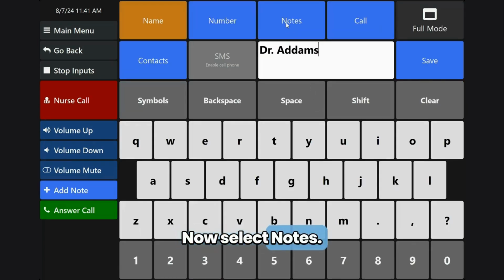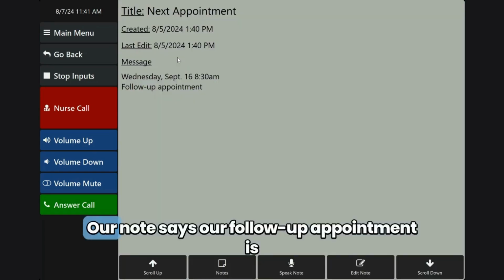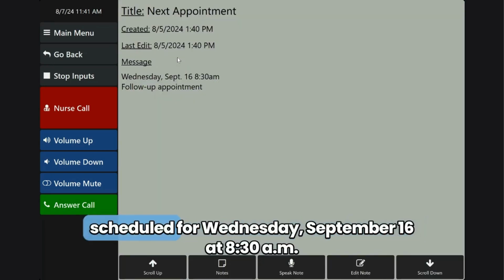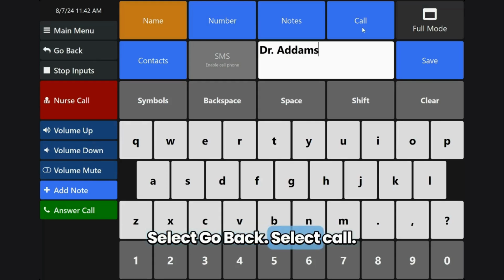Now, select Notes. When is our next appointment? Our note says our follow-up appointment is scheduled for Wednesday, September 16th at 8:30 a.m. We'd like to change that. Select Go Back. Select Call.